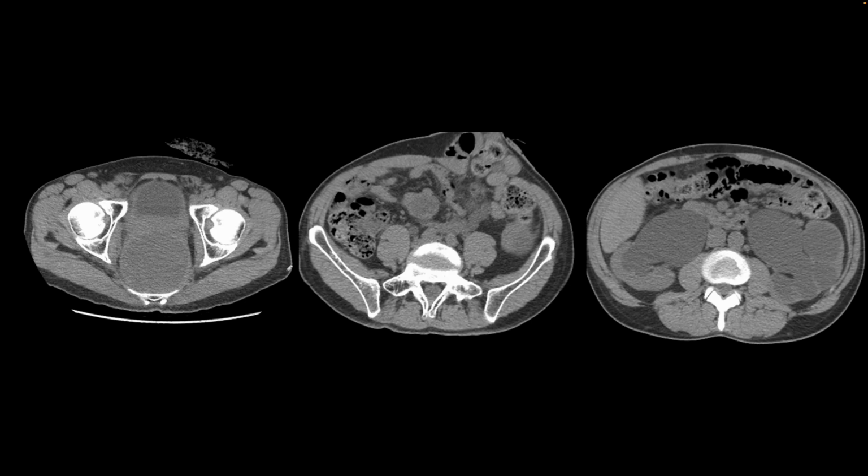Here is another interesting patient. They presented with CT of the abdomen and pelvis. They've had some kind of diversion, so we see colostomy and a parastomal hernia. The history they came in with was a colon cancer or a rectal cancer. And at the site of the rectum, there is this large hypodensity. We also find a metastatic lymph node and hydronephrotic kidneys.